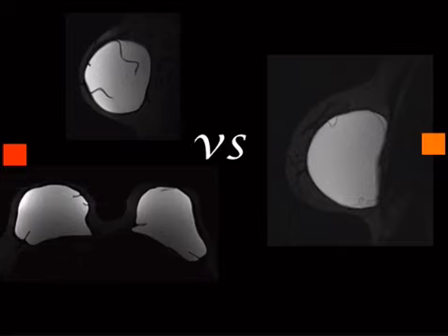Fat saturation is a really important thing. For MR of the implants, there's a special sequence that's done, which is a T2 fat saturated sequence, where basically everything is nulled out except for the silicone. And that's the only thing that you want to be able to see.